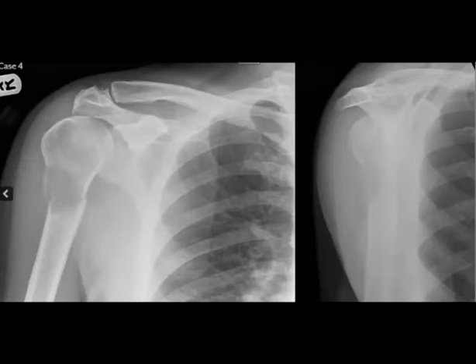Okay, the voice is fine now. So yes, it was the case, as you mentioned exactly. It was fibrous dysplasia. We discussed it many times. So what do you think about this case? Now we go to the rapid reporting mode again. So is it easy? Right humeral pathological fracture. Nice. I can imagine your answer. Yeah, pathological fracture. Perfect.